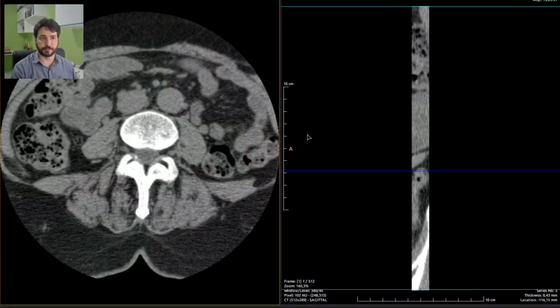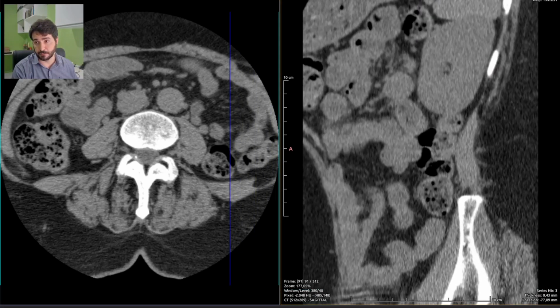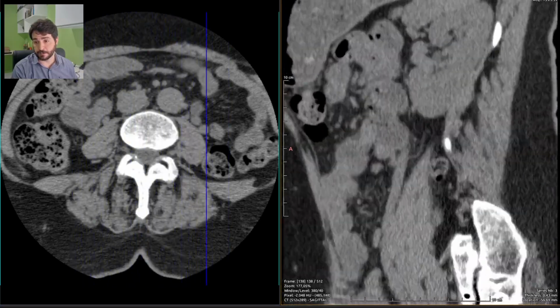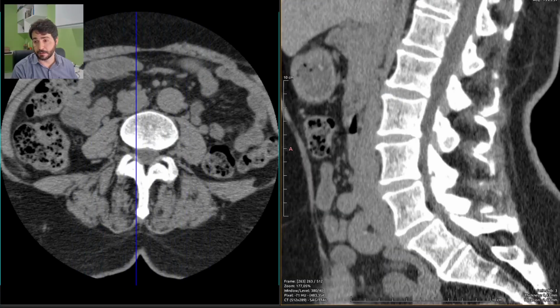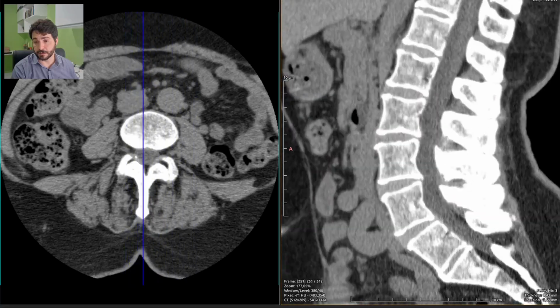I'll share with you the screen. I have already downloaded the first exam. This is a lumbar spine of an elderly female patient. She is 54 years old and complains of lower back pain, which is really common. So there is an odd looking last lumbar or sacral vertebra.